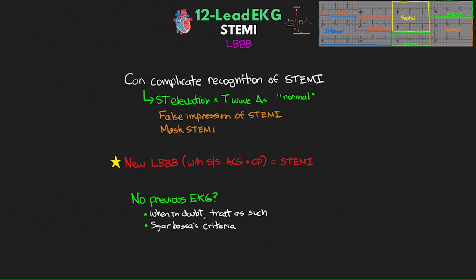All right, well, we covered a lot of information in this lesson, and this was a lot of really important information, as being able to identify acute myocardial infarction on EKG is probably one of the most important things to be able to do. Hopefully I was able to present this well and that you have a better understanding of what to look for when you're evaluating your patient's 12-lead EKG.